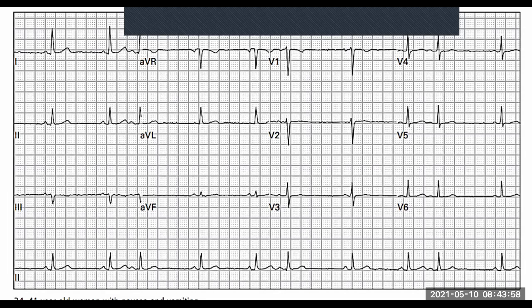All right. Now, we've covered the hows and the whys. Now we're going to have a look just at premature atrial contractions. So there's quite a few reasons why they happen, all right? But the important thing is that you have to be able to look for it. And the only way that you can look for it, and the reason why I picked it, is because sometimes you have to spend a few more minutes with an ECG than just having a quick glance.